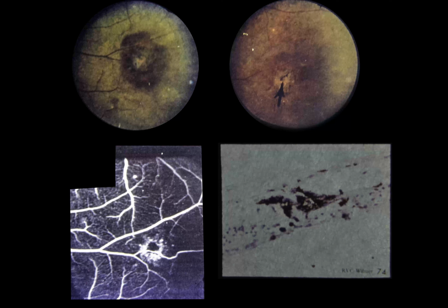Slide 74. Hemorrhagic and ischemic phenomena in hemoglobin SS. Sickling phenomena within retinal capillaries may lead to both hemorrhagic and ischemic infarcts in the retina. When finally resolved, these infarcts may have a variable appearance, and this has led to the use of such descriptive phrases as salmon spots, iridescent spots, and black sunbursts.